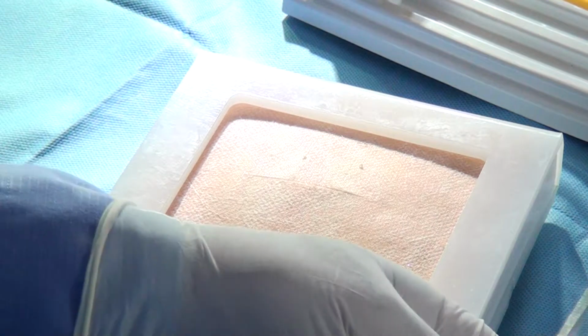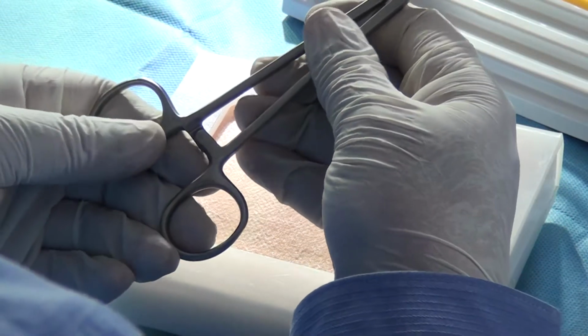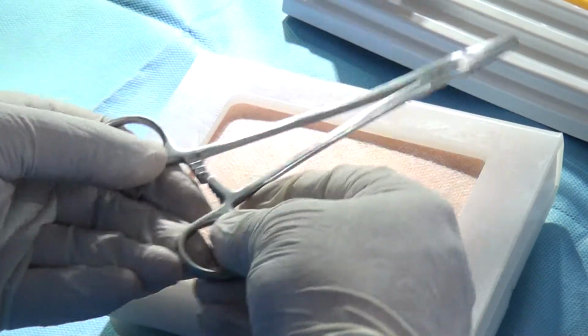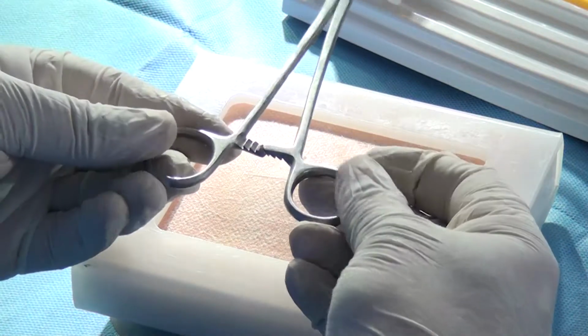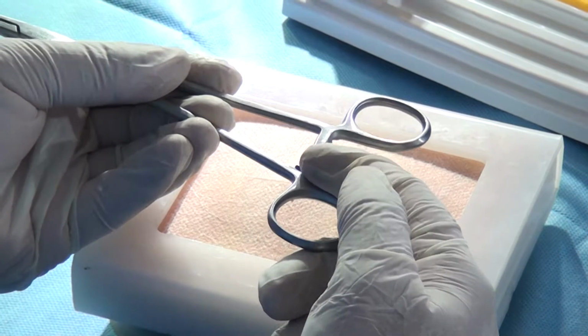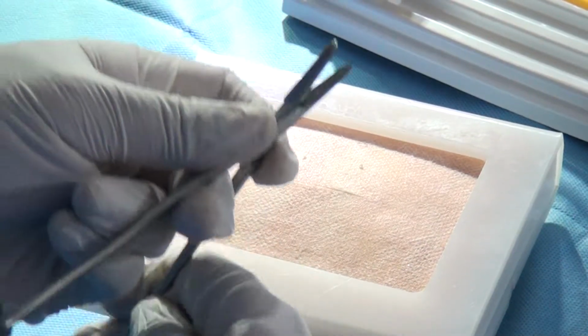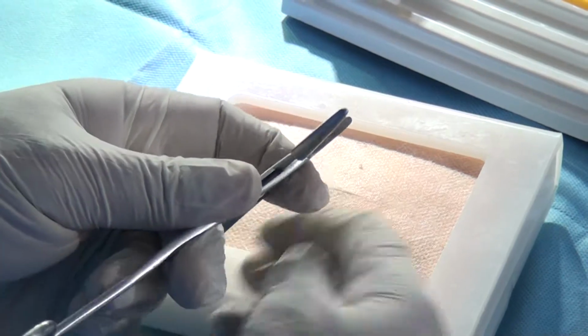The close cousin of this instrument, where I discuss the ratchets also, is a needle holder. That's going to be your life and death today. You'll be using it throughout. Remember, it also has rings at the back, ratchets here, a box joint, and look at the serrations.